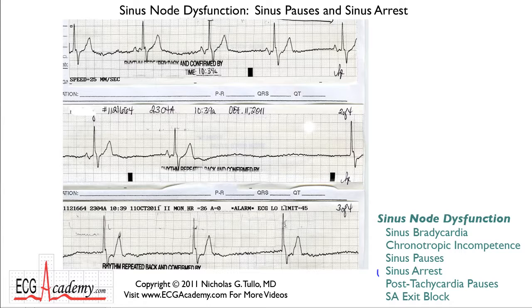In this rhythm strip, it's a different patient. We have a pretty slow sinus bradycardia here. If we count it up, 300, 150, 100, 75, 60, 50. It's above 40. It's somewhere maybe 42 beats per minute or thereabouts. And it's fairly regular, very slow. So you'd call this a marked sinus bradycardia. And then it starts to decelerate even further. You've got a long interval here.